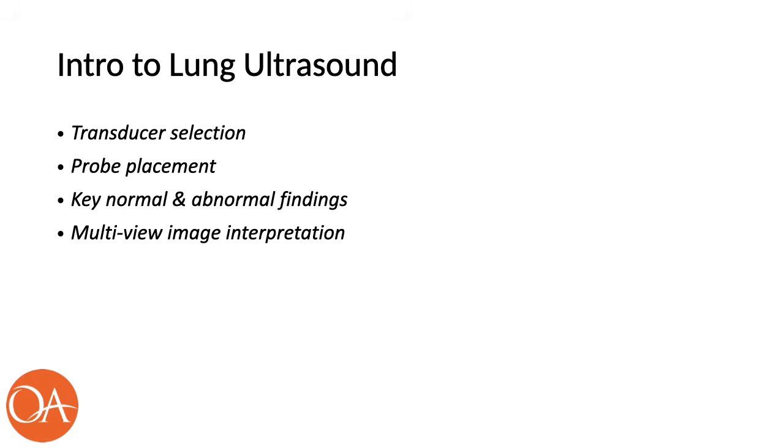In this introductory lecture, we will cover four aspects of lung ultrasound: transducer selection, probe placement, key normal and abnormal findings, and multi-view image interpretation. Let's begin with transducer selection.